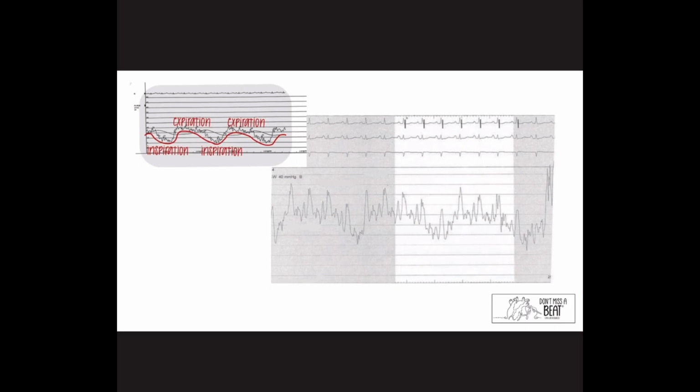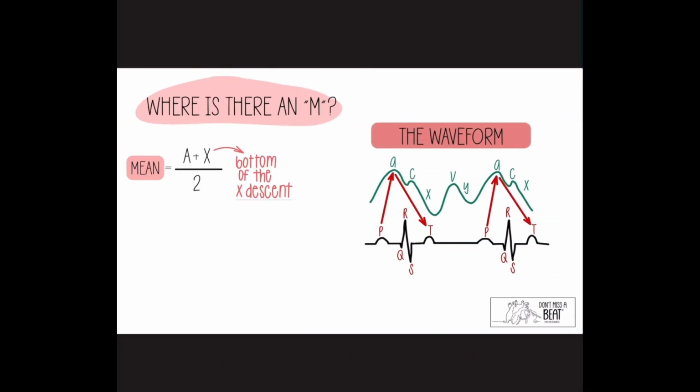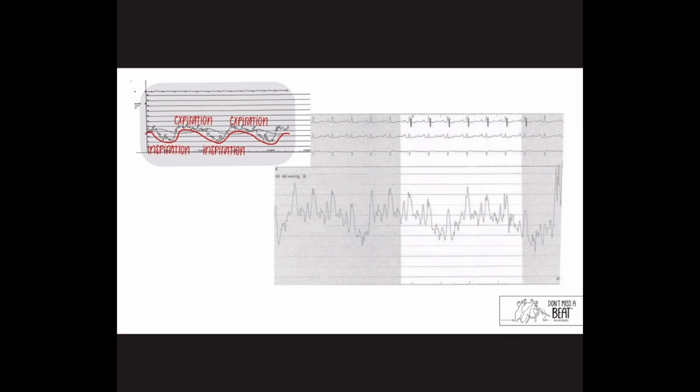Now, respiratory variance you can get with any pressure you have, especially if your patient has sleep apnea or really bad COPD. Remember, sometimes we're sedating these patients, which can exacerbate some of those issues. So if you see up here, this one looks nothing like this one. You do have the surface EKG to go off of, so we can talk about timing, but you see all these peaks and troughs. How do you know where to measure? Because the pressure down here will be very different from the pressure up here. Well, that's where, if you've ever heard it before, we want to measure at the end expiration.